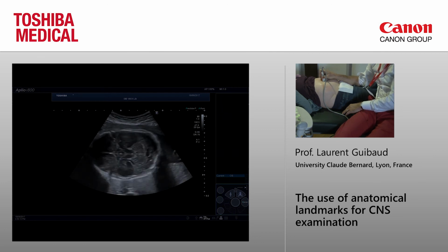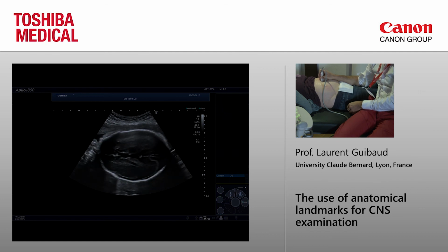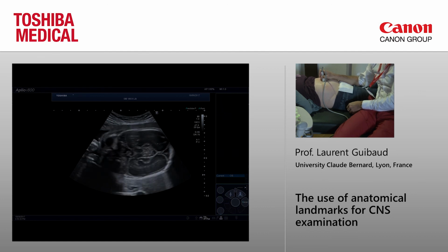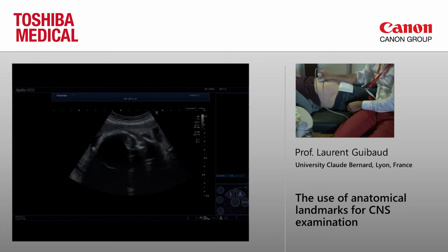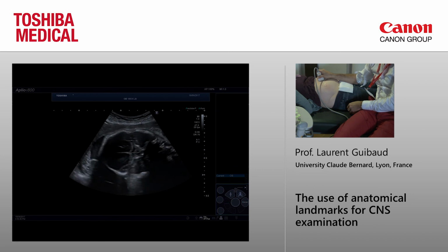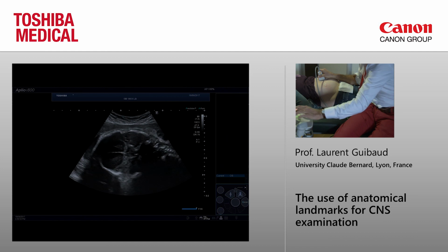I'm glad that you asked this question. I'm glad that the patient is 26 weeks because for me it's very difficult to see with ultrasound, and I'm not really sure to see it carefully. So I prefer to have a good view of the internal structures of the ear using MR compared to ultrasound. You can also try to see the olfactory sulci, but in fact, at 26 weeks, it's very difficult to see. There will be some indentation here, but at 26 weeks there is no way to see.